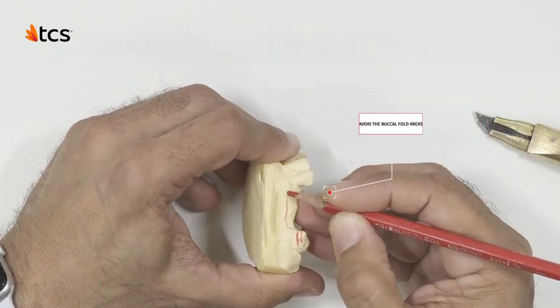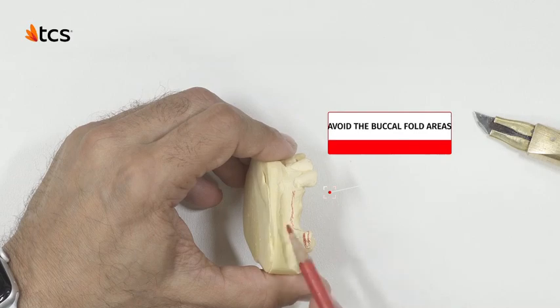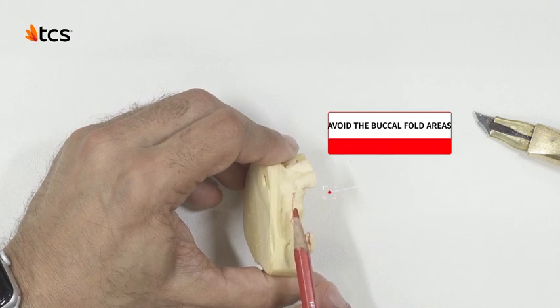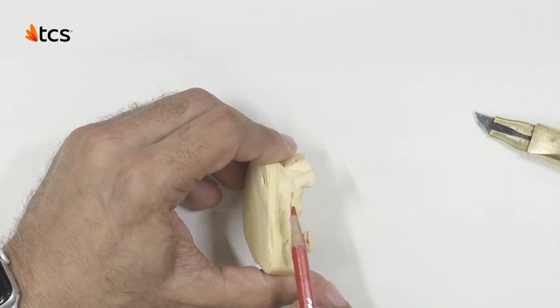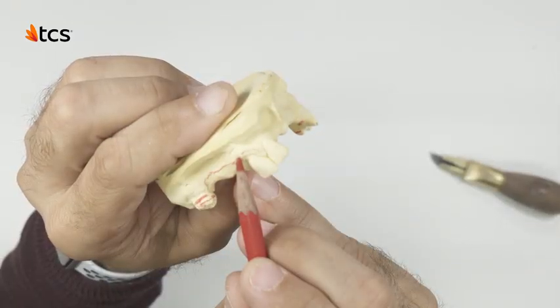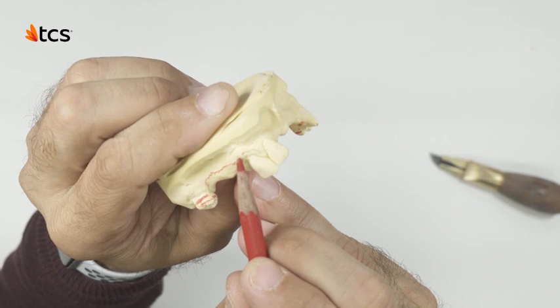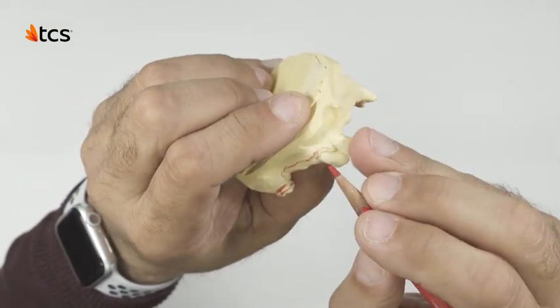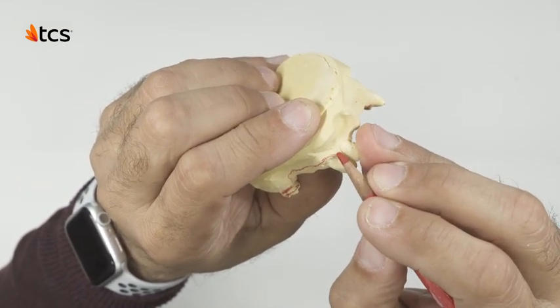Another standard rule of design is to avoid going into the buccal fold areas. Instead, stay at the height of contour. If there's any bone that is protruding, like this one, continue your design line staying at the peak height of the bone. Doing this will avoid disturbing any sensitive areas when inserting the appliance.